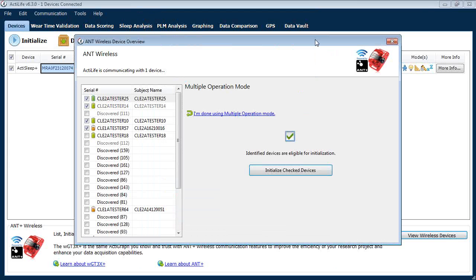One great scenario with this is that if you had a subject come into your office, you no longer have to ask them to remove the device off their person. You can ask them just to have a seat in a chair, and you start up the software and go from there, and you let them know, all right, we're done here. And that'll be it. There's no plugging in or anything like that.